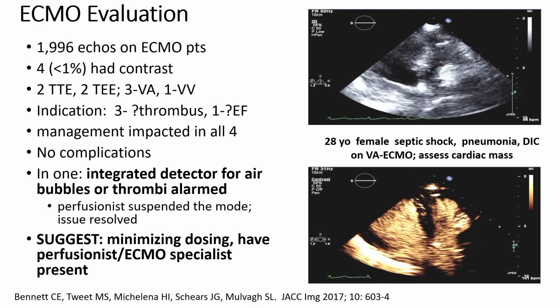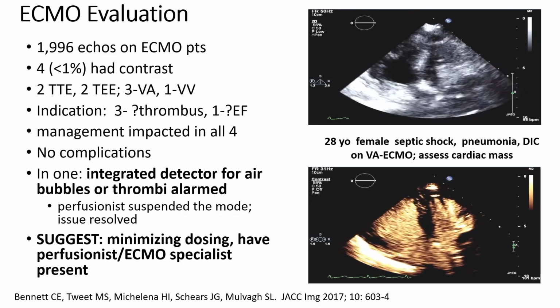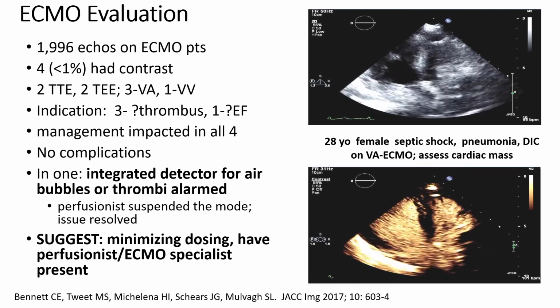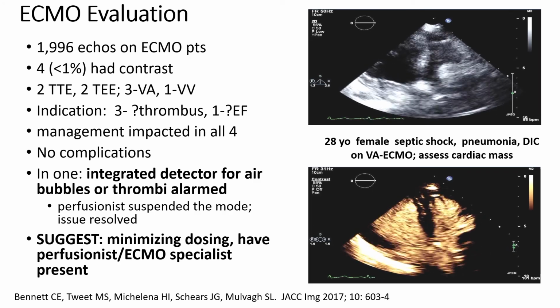The videos show an example study of a contrast benefit in a young woman on VA ECMO for complications of sepsis. A mass was seen on the non-contrast echo and was clarified to be extracardiac, consistent with a mediastinal coagulum causing external cardiac compression.